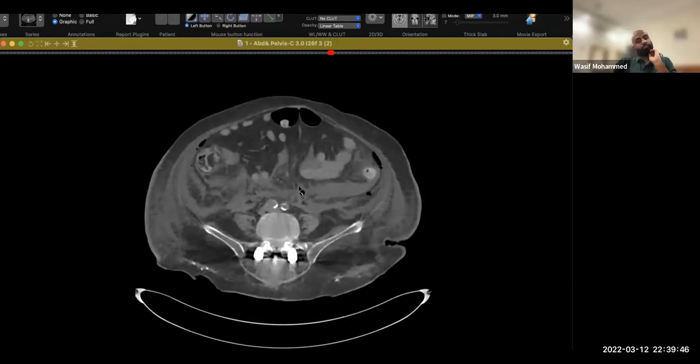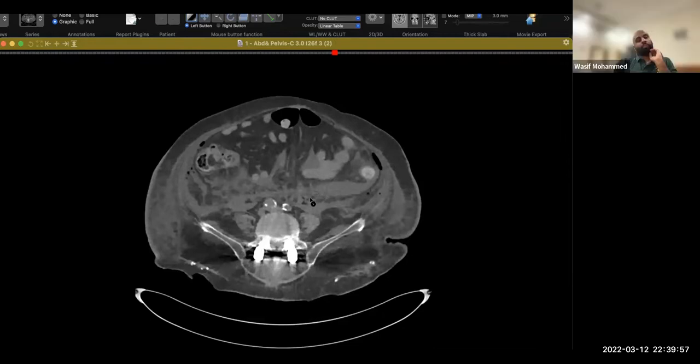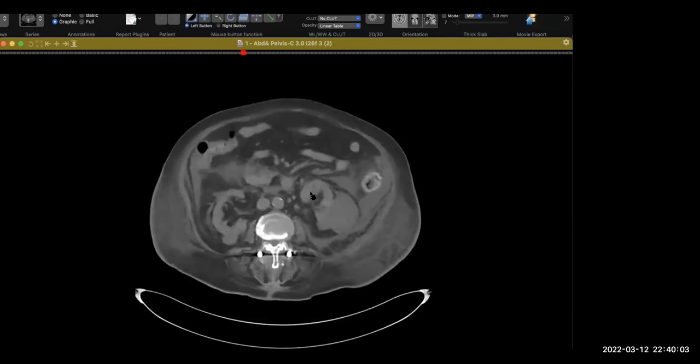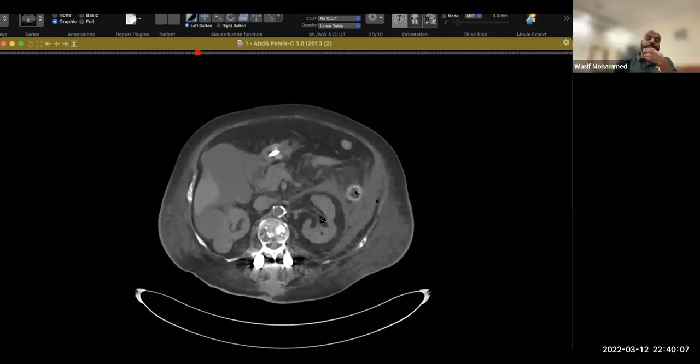So anything you can do for this patient? This is a surgical emergency if it has ruptured the bladder. So I would urgently convey my findings to the surgical team on call. I will tell them there is a suspected bladder rupture because a lot has been going on in the pelvis. Can you do anything better than that? Can you tell them a definite diagnosis?